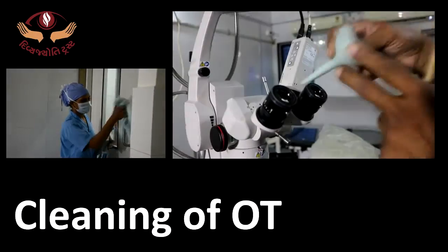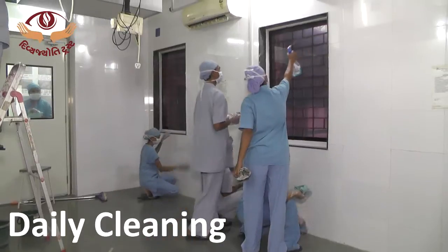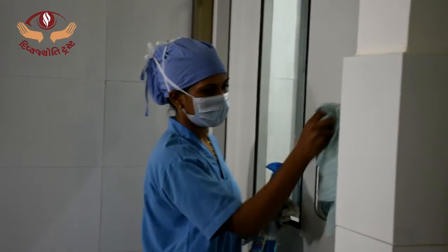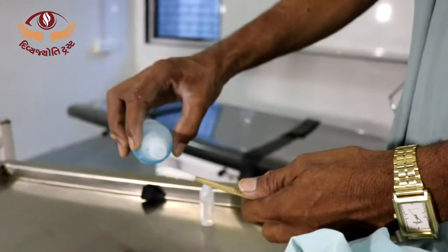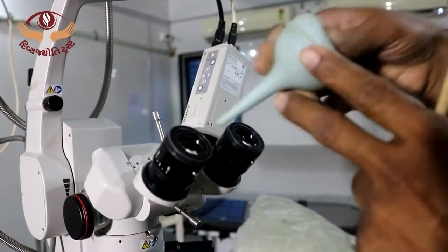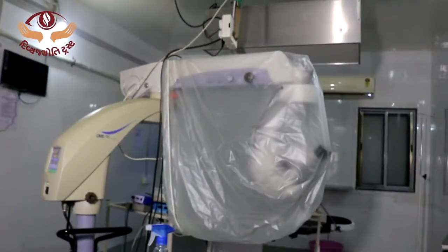Cleaning of OT. Daily cleaning. The OT walls up to 6 feet height, floor and doors are wet mopped daily with 1% sodium hypochlorite with the 2 or 3 bucket technique. Operating microscopes should be cleaned with 1% sodium hypochlorite. The microscope head is cleaned with Bacillol 25% sprayed daily and covered properly.